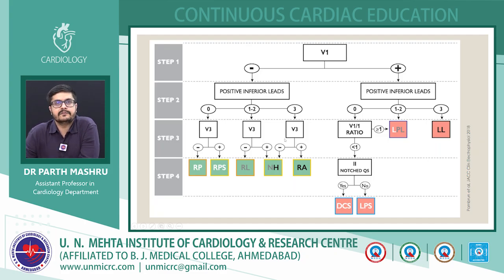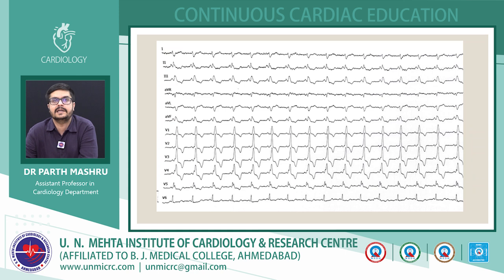So I know these are very complex, and if you just try to mug up these algorithms, you are never going to remember these and you are never going to reach the diagnosis. Therefore, I am again emphasizing the basic concepts of pre-excitation and how to systematically approach an ECG when you see that patient for the first time in the OPD. You won't be able to remember which algorithm to use. So if your logic is clear, you can easily reach the diagnosis, which we will see in the subsequent slides with examples. So this is the first example.